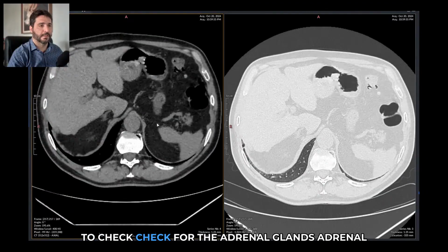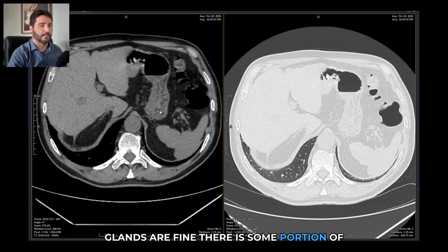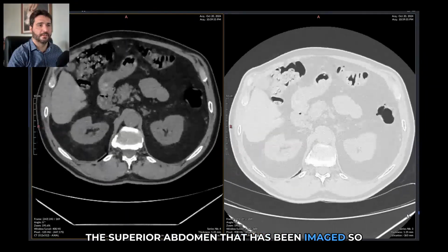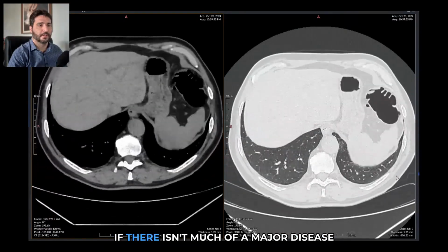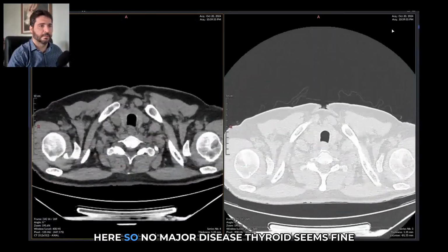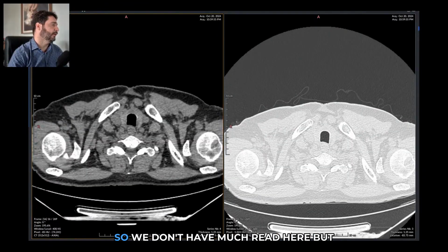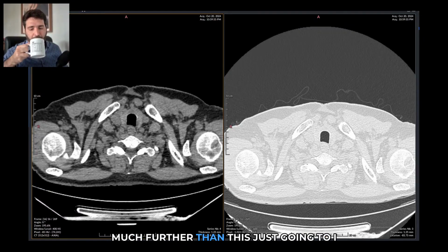So we have also to check for the adrenal glands. Adrenal glands are fine. There is some portion of the superior abdomen that has been imaged. So just going to check it out to see if there isn't much of a major disease here. So no major disease. Thyroid seems fine. So we don't have much here, but we can already report this exam. It isn't going much further than this.